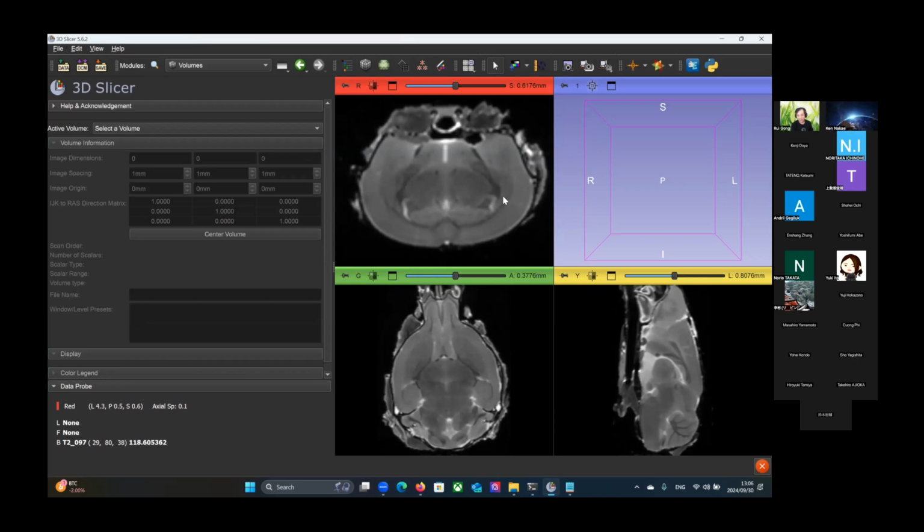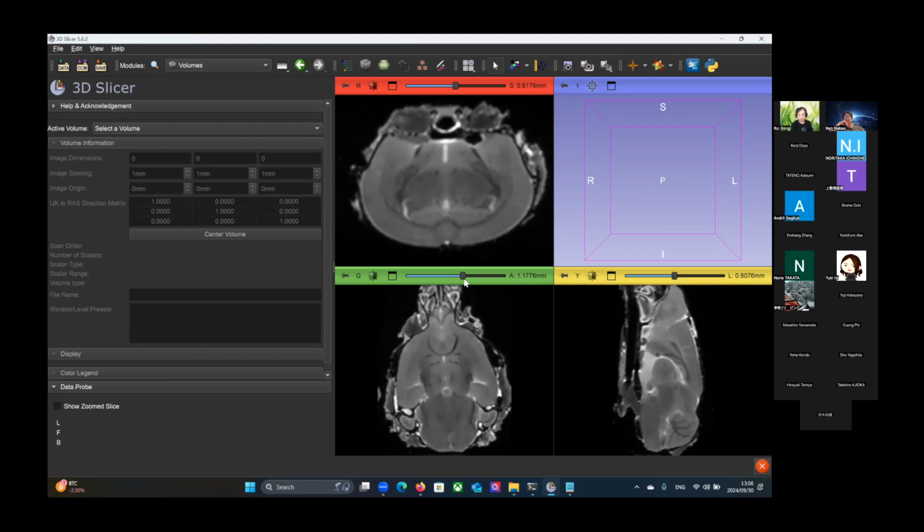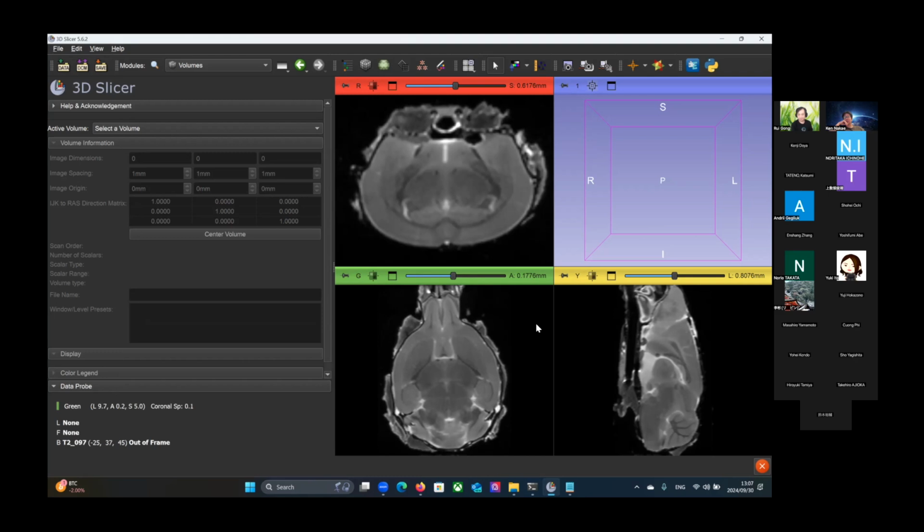So we are starting the discussion on what the data is. There's not only Yagishita-san's laboratory, there are other people here too, but we use this as an example. So this is MRI data from the Yagishita laboratory at Tokyo University, and this is mouse data, T2 weighted image data, with some kind of skull included, I don't know. But it just includes the skull of the mouse. And your purpose is to register from the individual brain to this template data set finally.